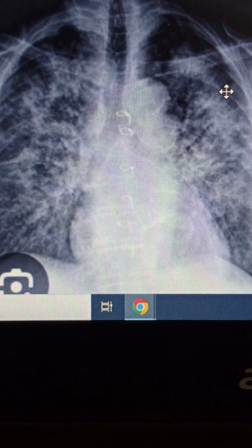Right, I am Dr. West and today we will discuss another chest x-ray. So, can you spot the abnormality in this x-ray? I give you 5 seconds. Right, I will give you a clue over here and then you will have to find a diagnosis.